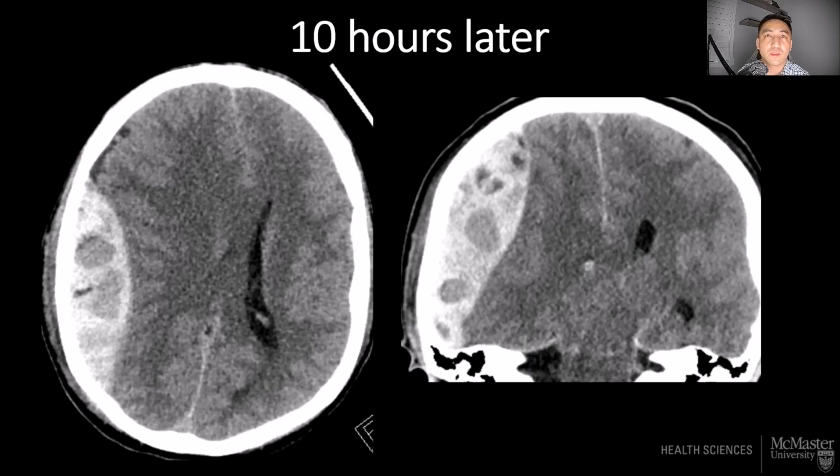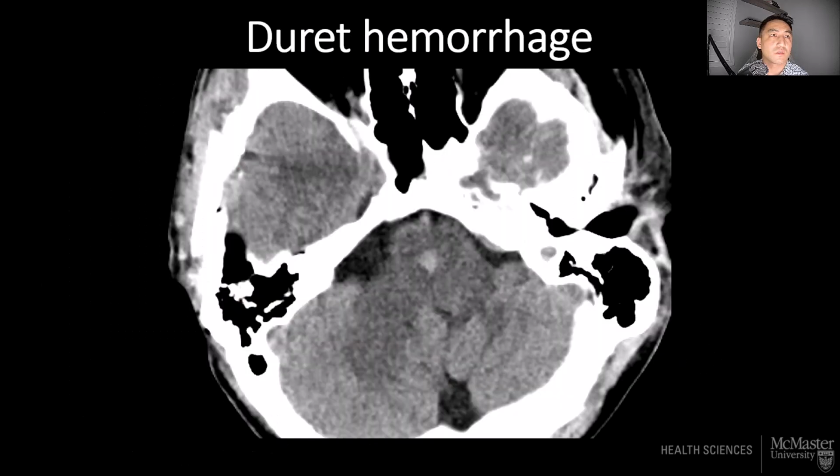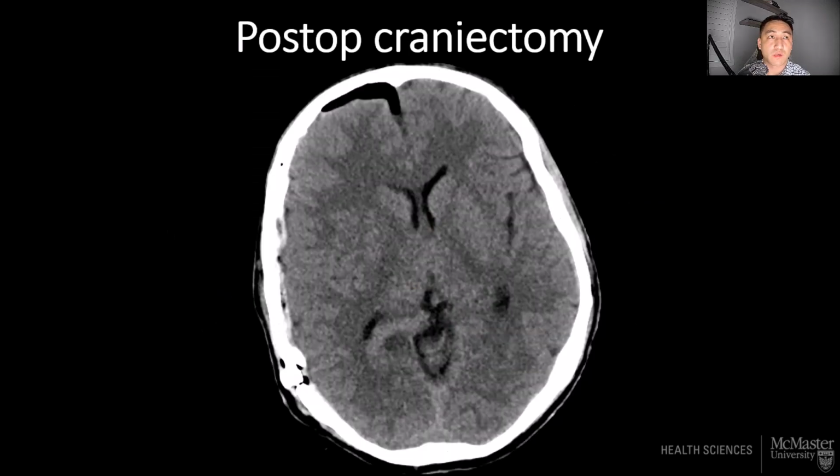Now, arterial hematomas tend to expand, so the patient was brought back 10 hours after, unresponsive this time, with a much larger hematoma, and we can see multiple blobs of hypodense blood indicating active extravasation. We have significant mass effect, herniation, and Kernohan's notch. We have central herniation causing a Duret hemorrhage. The patient required an emergent craniectomy for preservation of life. The patient did well postoperatively and had only a small ischemic infarct in the right parahippocampal gyrus from herniation.